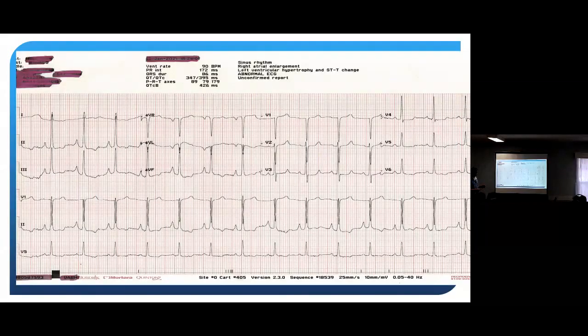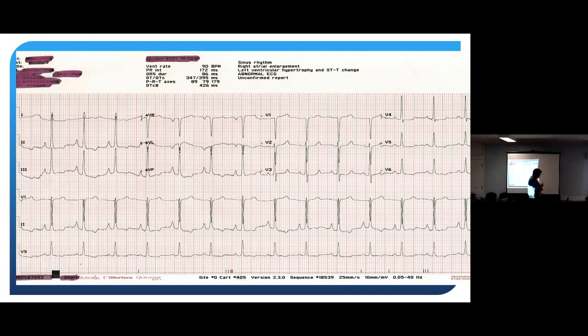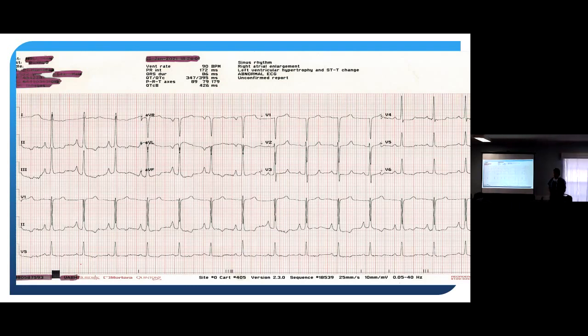So last 12 lead, and this was brought up to me by a department up north that was talking about they're seeing a lot of people come to the station now that want to get well checks, don't want to go to the hospital because of COVID. People were doing it before then, but so they're doing 12 leads and saying, oh, your 12 lead looks good, you can go home, all right? So this 12 lead, too fast, too slow, or okay?